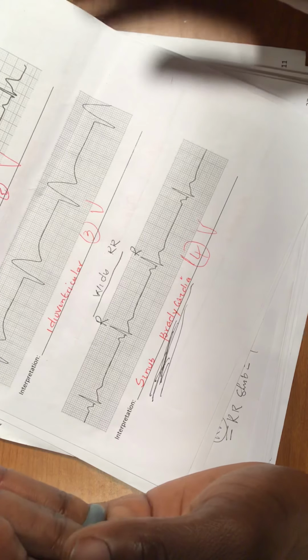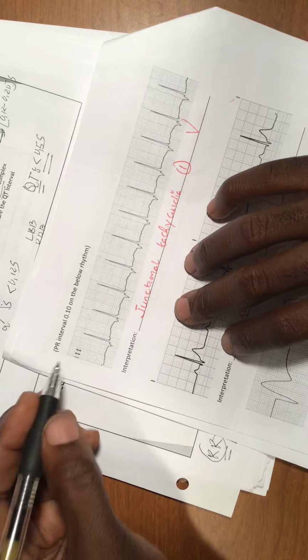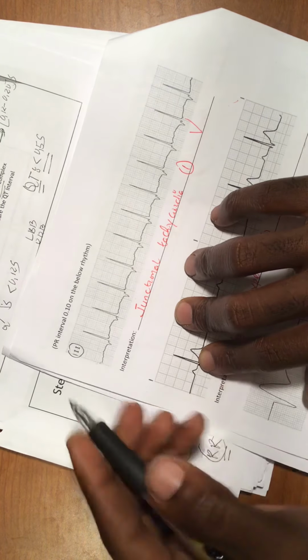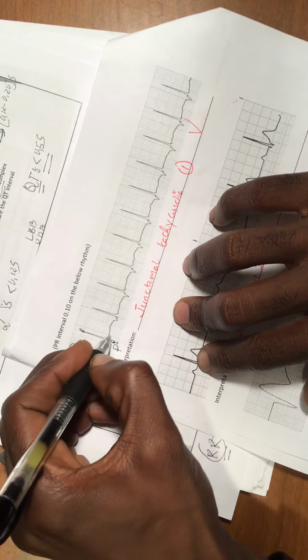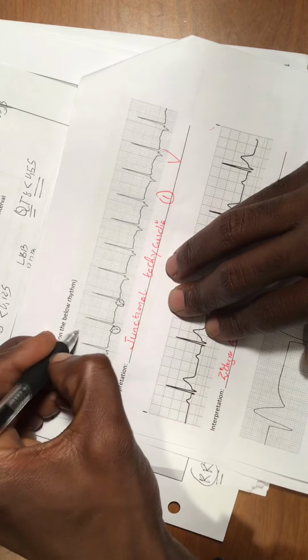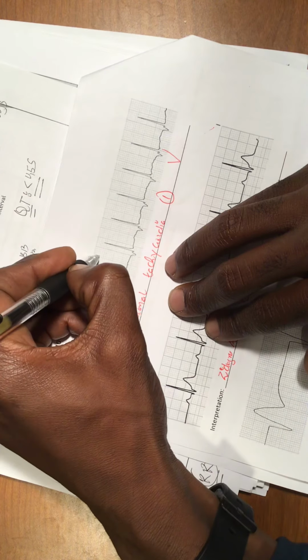Those are very important. And there's something that I was telling you about. Let me show you an example. Remember that I said in lead 2, see, we are in lead 2. If you can see it with me, this is lead 2. You have your P wave right here, and you have your Q or S. You see your P waves are inverted. All of them are inverted. They are not upright. They are downward like that.